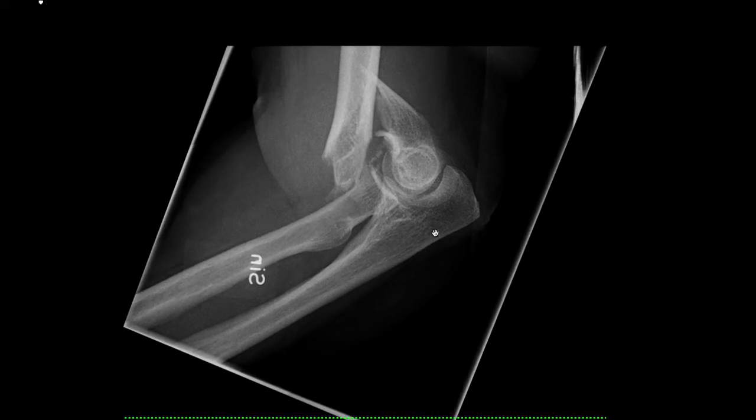We all know that. And your job as a radiologist is basically to describe this fracture. It's not that difficult, guys. Of course, you can use all these eponyms, but that's more for nice vocabulary. What you really want to tell the clinician is the way the fracture looks, the way it is dislocated, and some other important findings that you might find.